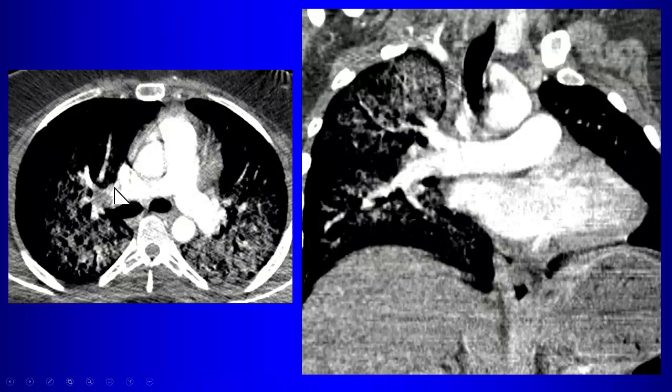This is a very typical location to get a fake out on the axial images, because this is right where you have the bifurcation of that right pulmonary artery into the interlobar branch and the branch to the right upper lobe, the truncus anterior. And then right in here, you can have soft tissue, you can have lymph nodes. So when you take an axial cut through there, it almost looks like, or it does look like, there's a filling defect in the right pulmonary artery. So that's a common place where you can get fooled.